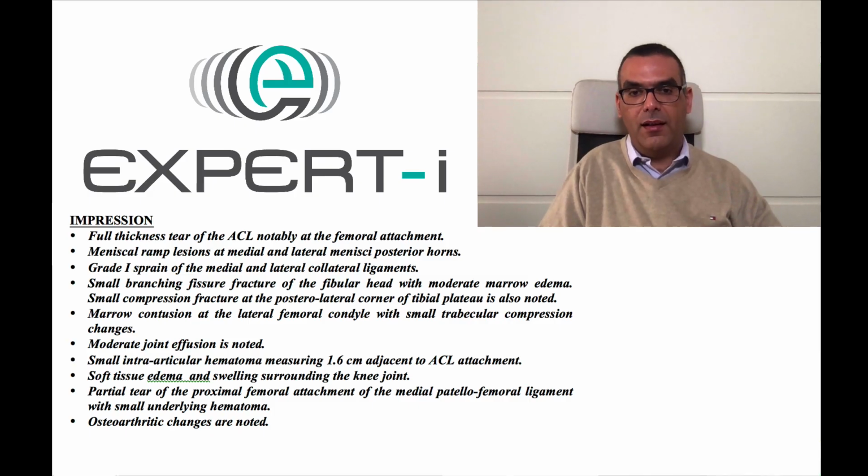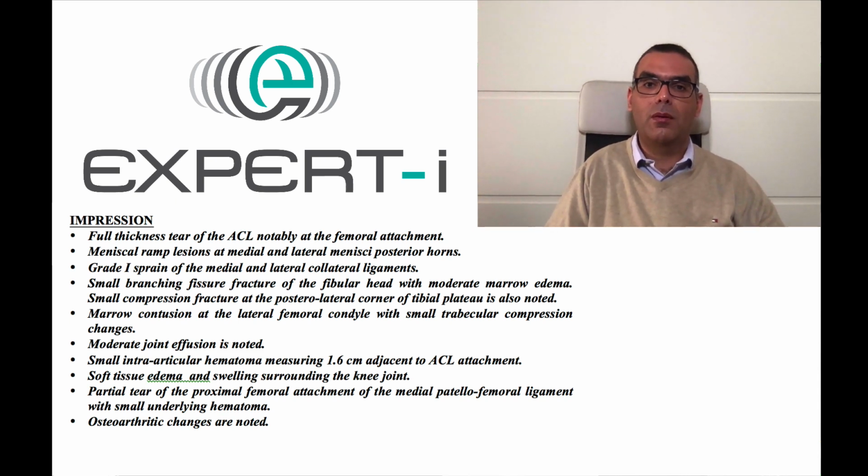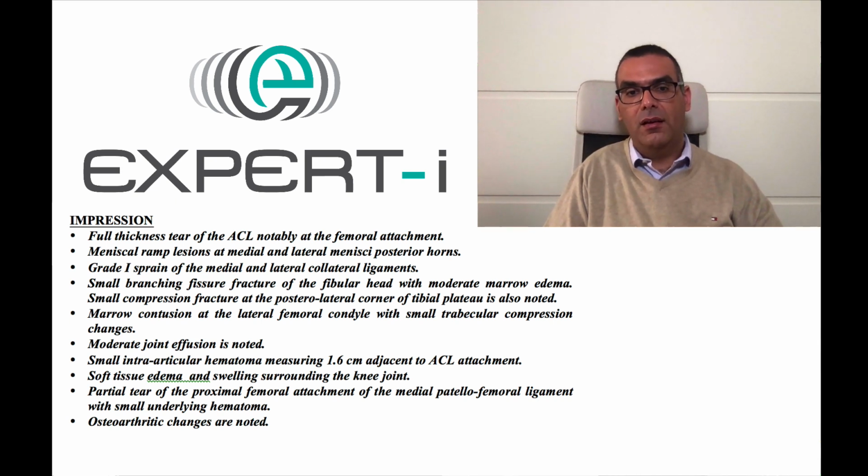So again, a very condensed report. I'm just showing the impression because the report took 2 full pages to describe, and just take it step by step. I'm trying to put cases with multiple pathologies to speed up our reviews.